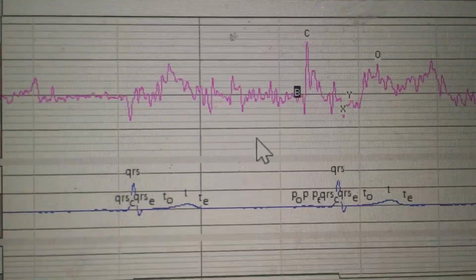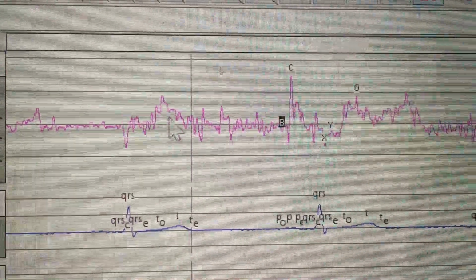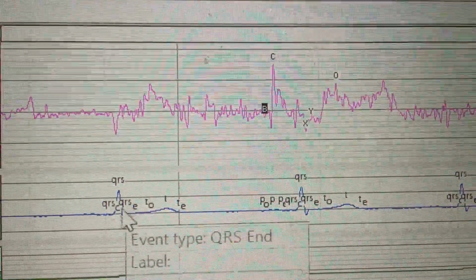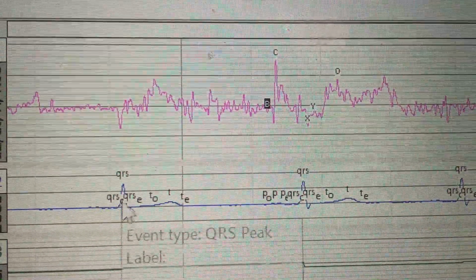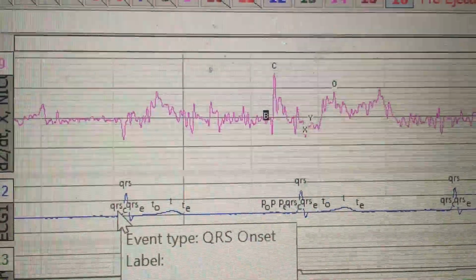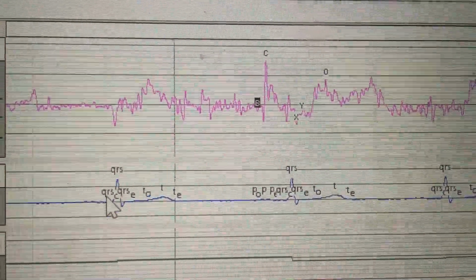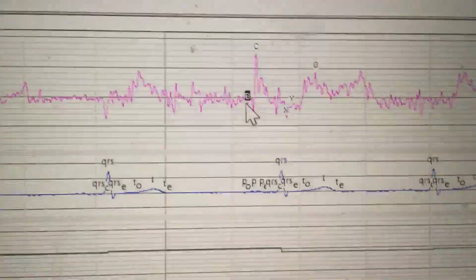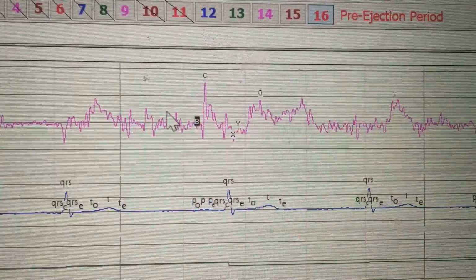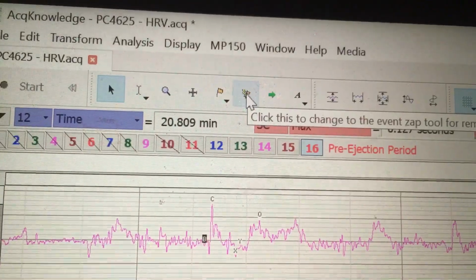Best thing I can see what happened here is there was a non-labeled cycle. And then there was a labeled cycle. That B isn't bad. But what's happening is calculating from the QRS onset, there it is, which is officially the Q point, from the Q point of the ECG to the B point, and you see it crossed over an entire cycle. So that's the matter there. So I think what we're going to do is just delete this cycle, even though actually it looks labeled reasonably well as it is. I think it's best to delete it.